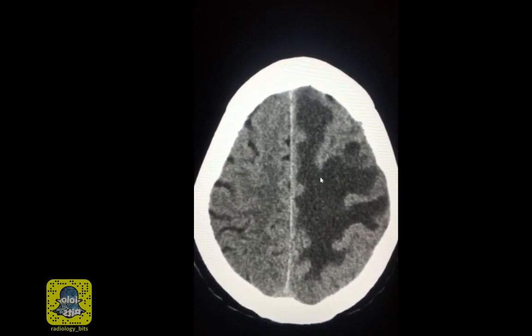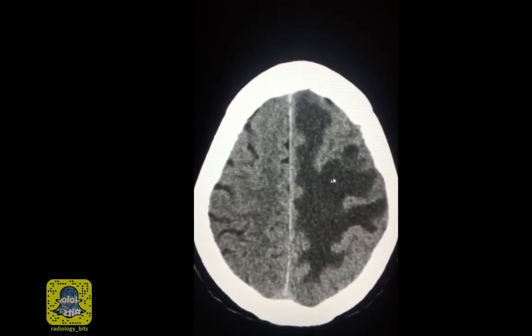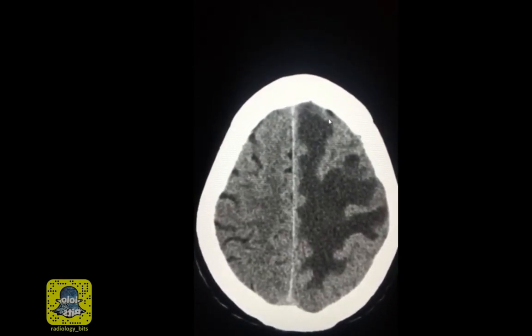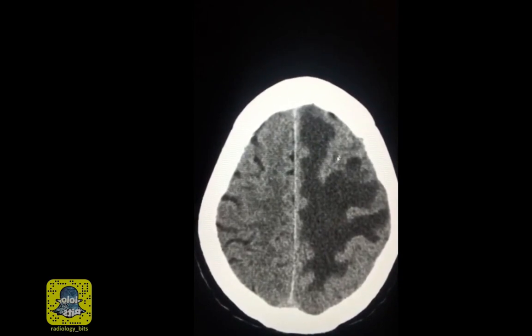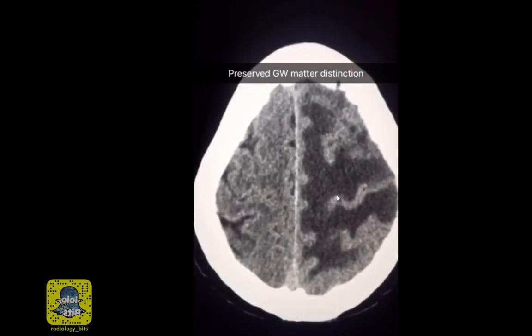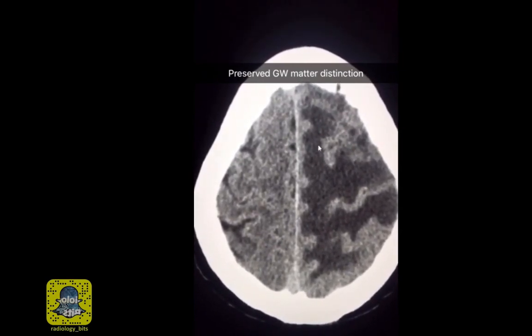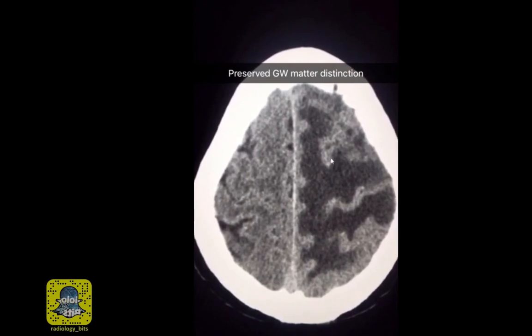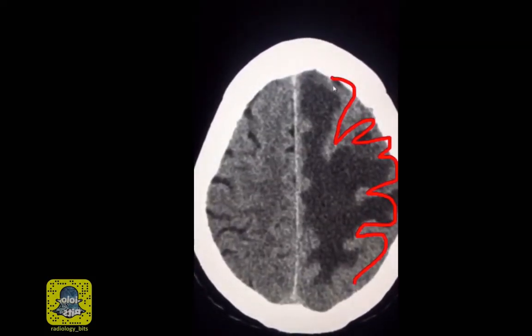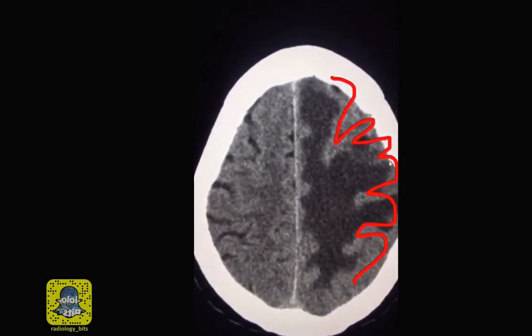However, the edema that you see here has different features. First, it's purely involving the white matter. The gray matter, the cortex here, is well preserved. There is no loss of the gray-white matter differentiation. To the opposite of that, the hypodensity leads to a better appreciation of the gray-white matter distinction. If you try to follow the undulating cortex, you notice that there is no disruption of that cortex.